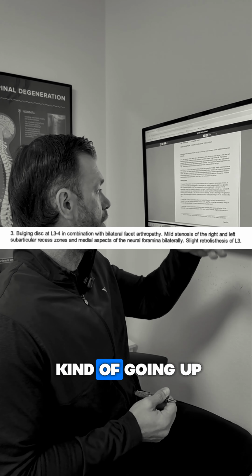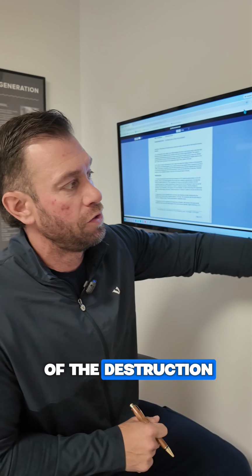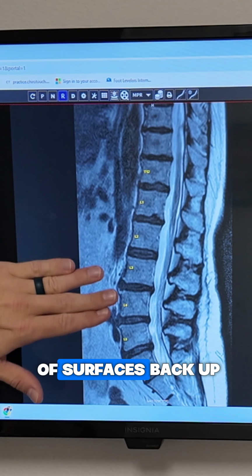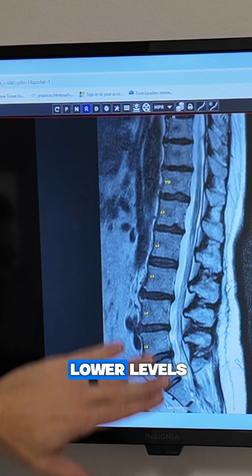When we go to number three, bulging disc at L3, L4, again, they're just going up the list. And this is very common. Most of the time we see a lot of the destruction happening at the bottom because weight and gravity load at the bottom, and then it kind of surfaces back up. So most of the damage that we see here is typically at the lower levels.